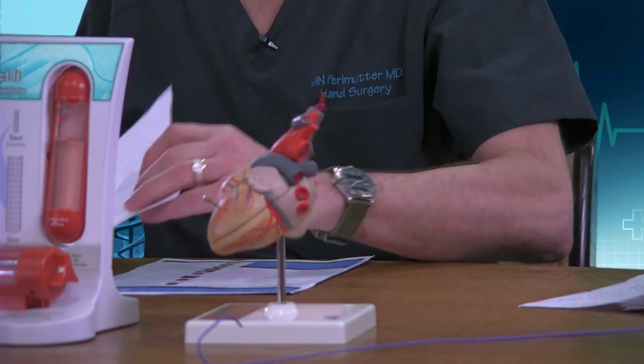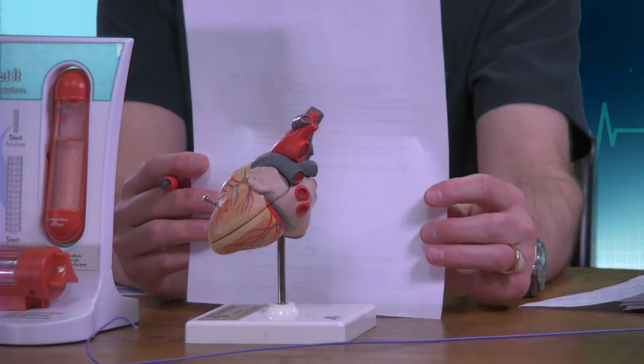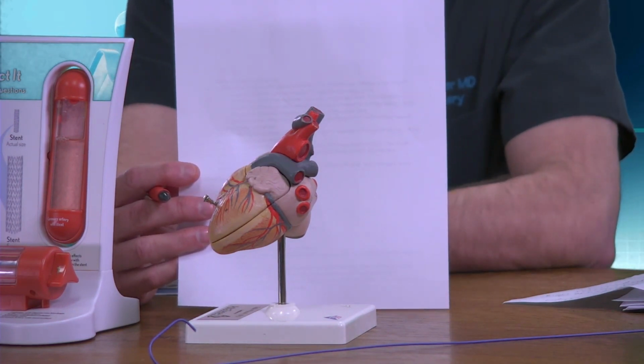Could you zoom in again, and can you hold the stent close? Oh, I understand. Why don't you come around and show the stent against the model that you have here? Are you able to zoom in on this plastic model? All right. Okay, Doc. So I'm giving you a little bit of a white background here. Can you show us the size of these stents and wires that you use relative to this?